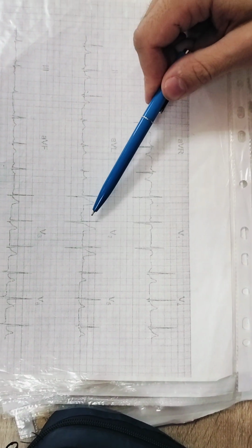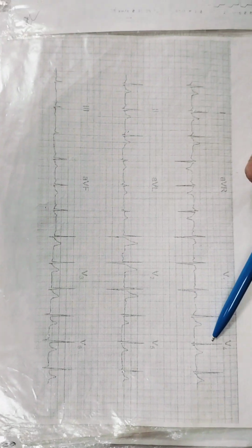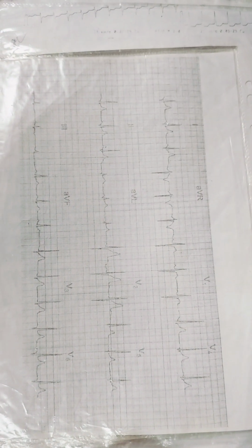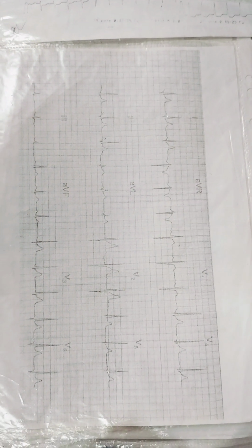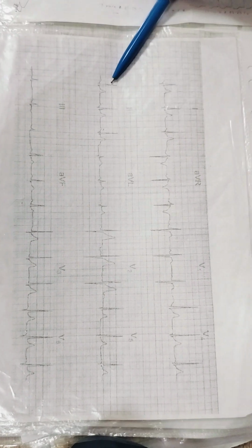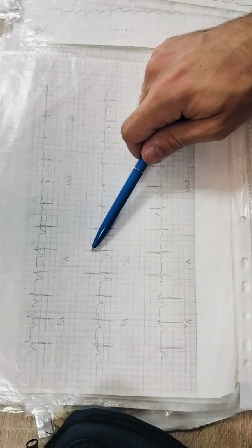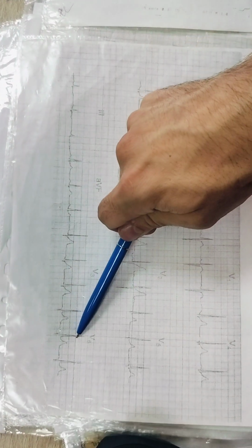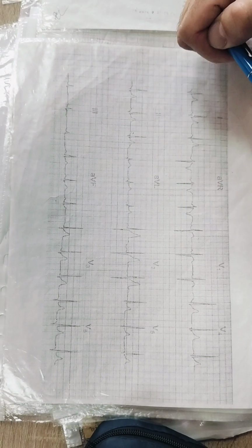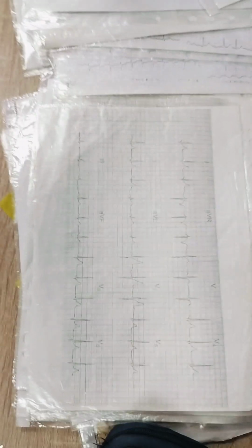And look at this lead. S equals R. Normally it should be in V4. So this zone moved higher to V1, V2. Currently it's in V2. One more criterion. There is no shift of the electrical axis of the heart, but there are these criteria. R equals S in higher leads. V6 has big R waves, V1, V2 have deeper S waves. Sum of R and S is more than 35 millimeters.